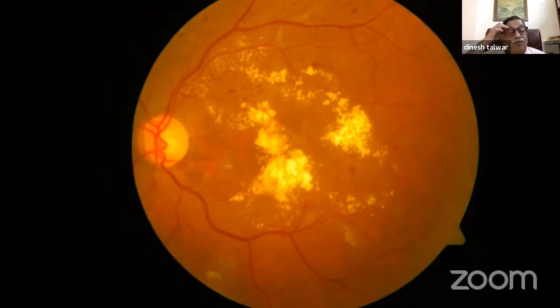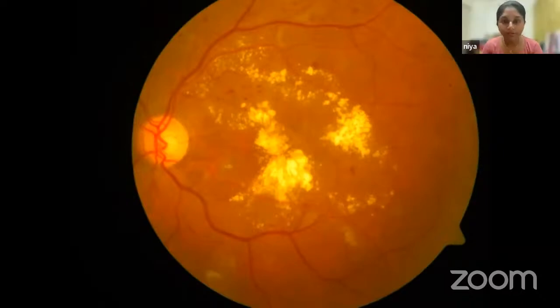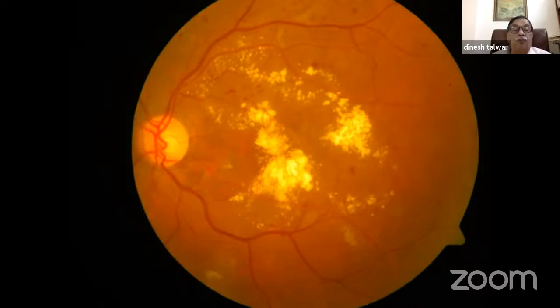What do you expect to be the vision of this patient? Since the hard exudates are at the fovea, the vision will be less. So do you expect him to have, say, 6/9, 6/12 vision? No, sir. It will be less than 6/36. Okay. So in this particular patient, what would be your anti-VEGF drug of choice?